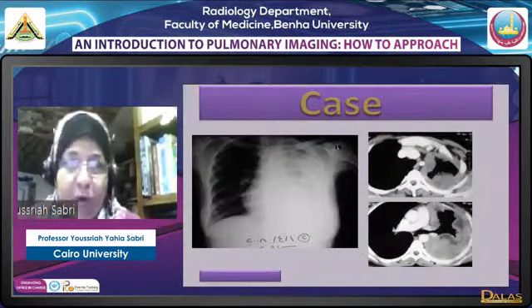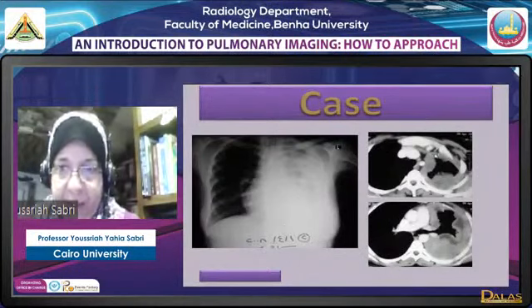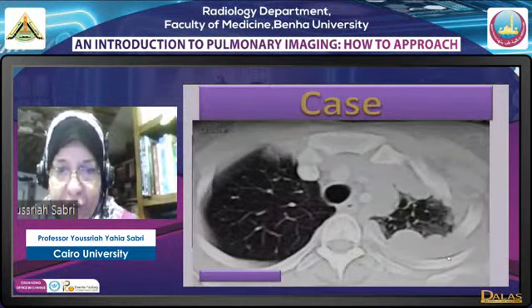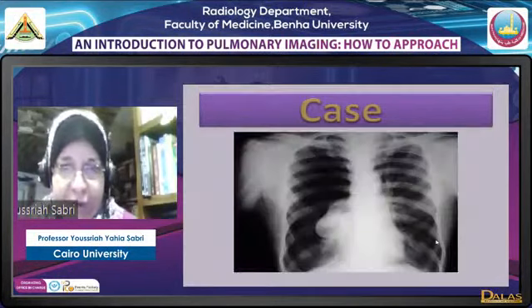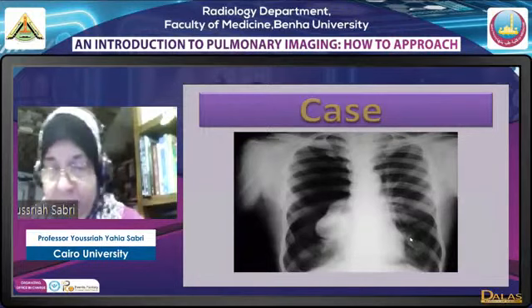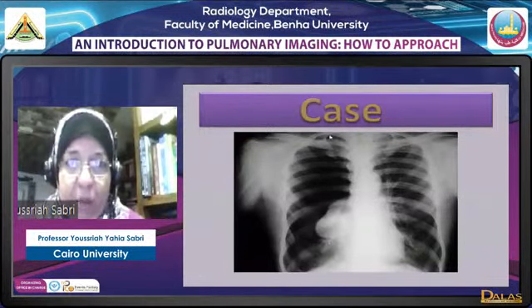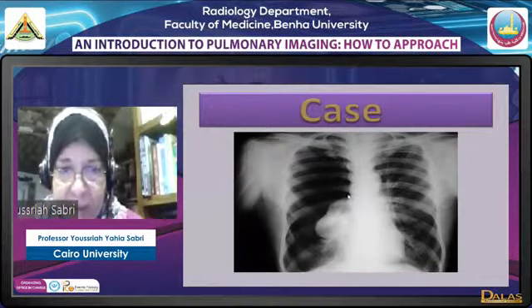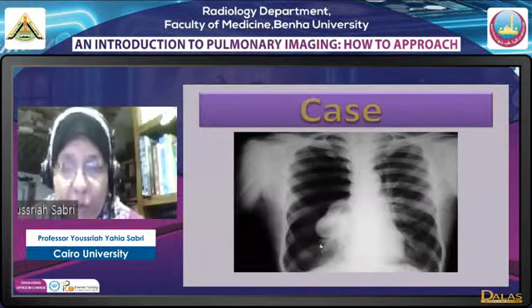Here we have an opaque hemithorax. In axial images, we have the nodular circumferential thickening of the pleura, classic for mesothelioma, giving again in the plain film an opaque hemithorax. Now shifting from opaque to black hyperlucent hemithoraces, we have this classic appearance of jet black right lung with right hemithorax, with a total collapse.